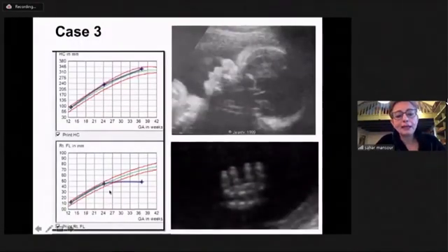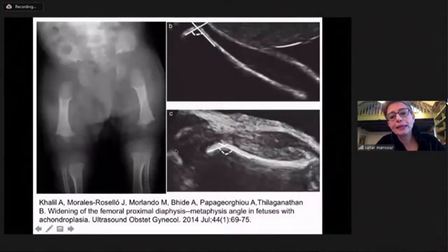This is a baby showing a tail off of the femur length from 24 weeks and a relatively big head, macrocephaly. You can see here the depressed nasal bridge, the saddle nose, the frontal bossing. So this is a typical profile. And these are the trident hands. There's a gap between the second and third fingers, and the fingers are a little short. So this represents achondroplasia.